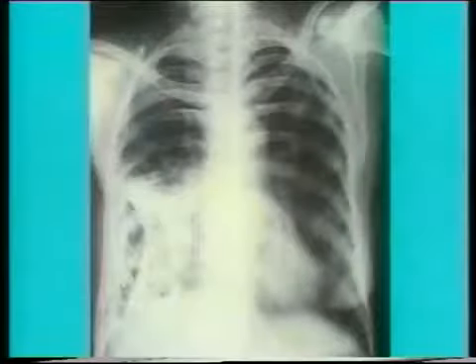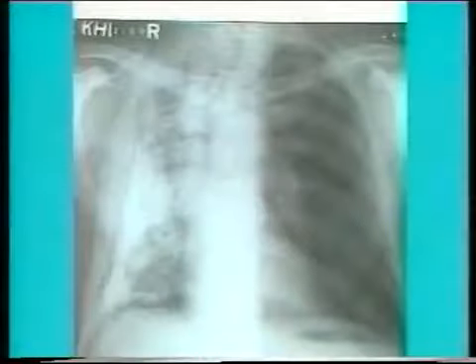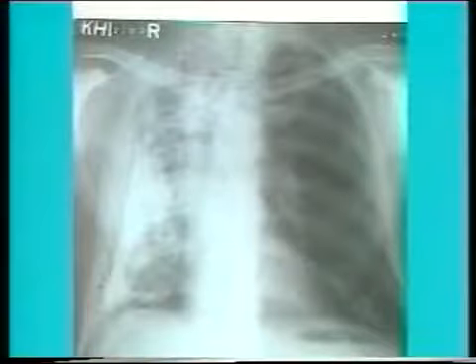This is another typical pleural calcification. It is a very dense and irregular sheet-like opacity with no fixed distribution pattern. Note the sheet-like opacity denser than the ribs with no fixed pattern. This is another X-ray of pleural calcification with dense, irregular, sheet-like opacity. Note in the close-up view its density, pattern, and the typical appearance.